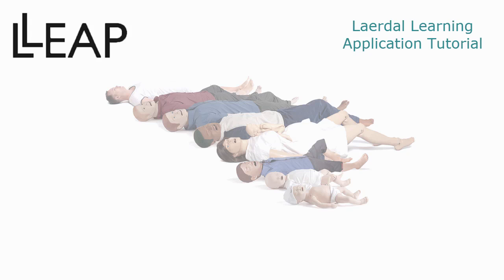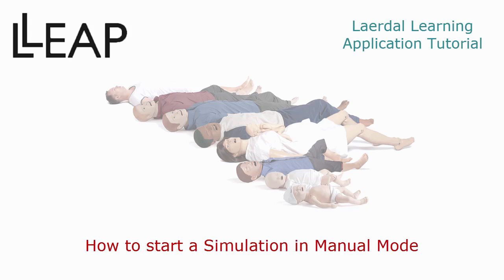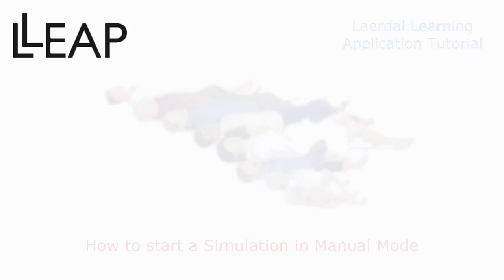In this tutorial you will learn how to start a simulation in manual mode, and you will also get an overview of the LEAP interface when running your simulation in manual mode.